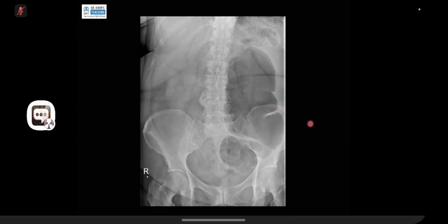So anatomy wise, you say, what is happening? This is not the location of cecum. But if you know your pathology, this is what happens. So it will be always here or here. It will never be here. Interesting. It will never be there. So this is cecal volvulus.